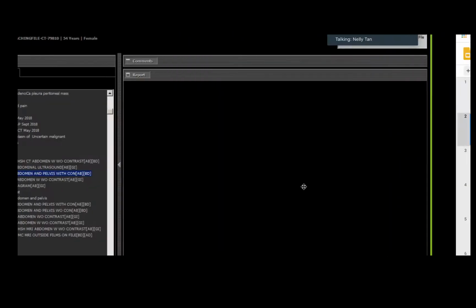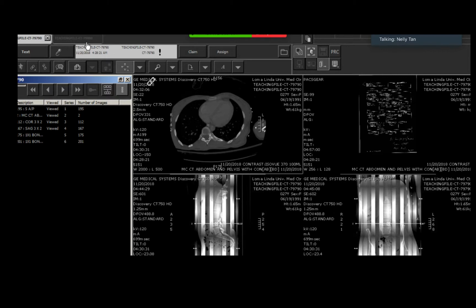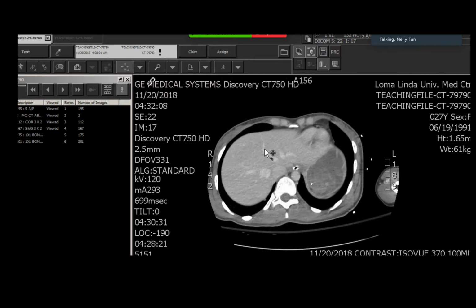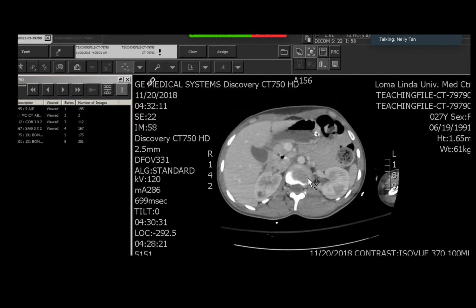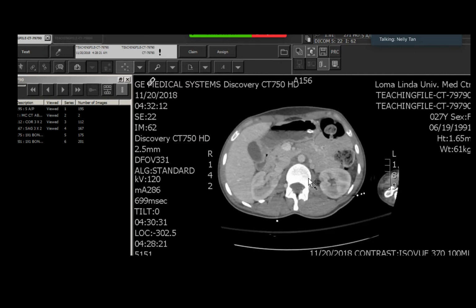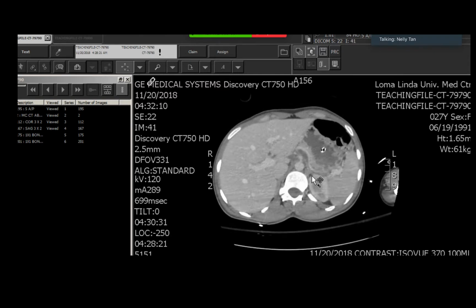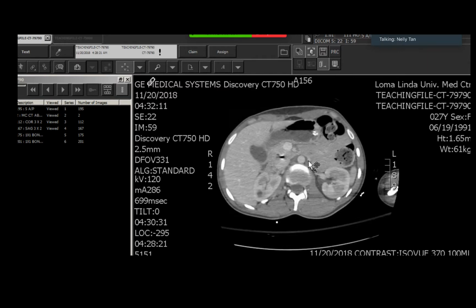And these are the findings, but I'll show you. So this is the first CT scan that was done. Our images default in the bone window for unclear reasons. So this was the image, or the CT trauma patient. So this was read overnight, and the resident astutely said, there's this sort of weird finding in the retroperitoneum.